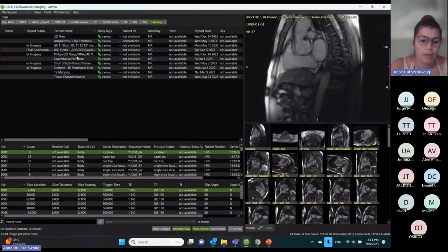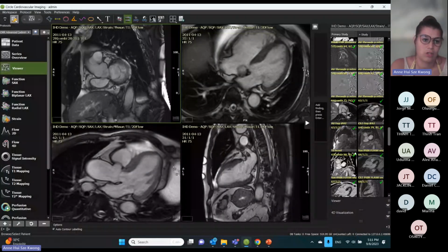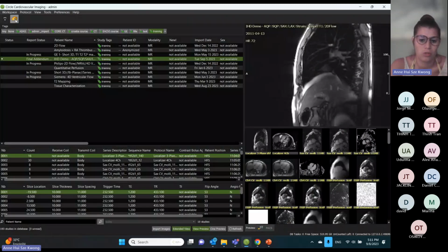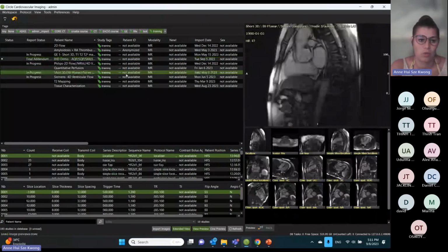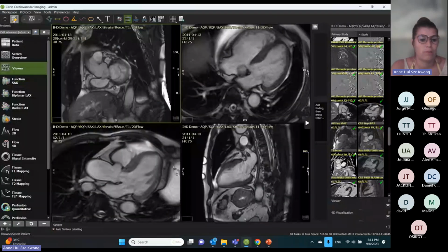If you want to open a patient, you just double click on it. When you open the patient, you arrive in the post-treatment frame. You can jump between the post-treatment frame and the patient list with this big yellow cross. For example, if you want to look at another patient, you can always do it even if you already have one patient open. So you can just switch between both frames.